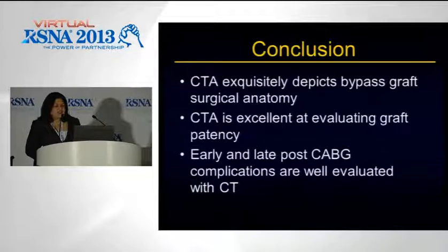So CT exquisitely depicts bypass graft surgical anatomy. As I've shown, it's excellent at evaluating graft patency, and we can really see early and late complications very well with CT, and we can communicate this very well to our referring physicians and surgeons, even with the images.